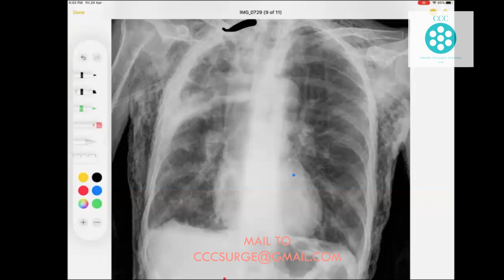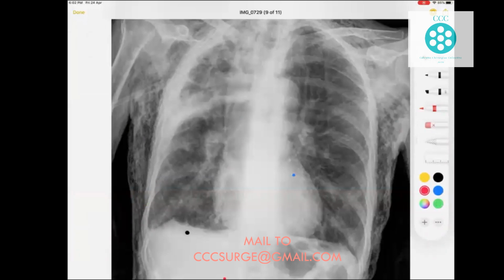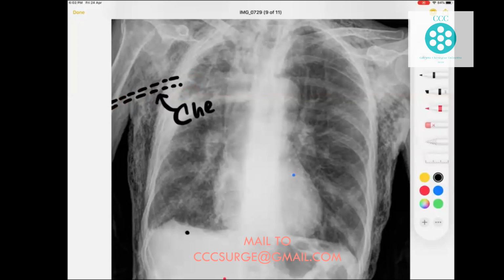Okay, let me see. I can see a fracture. Maybe there is a fracture of a rib, along with a surgical emphysema, and at the end of the day someone is pointing out, sir, have a look, what the hell is that one? If that is this pipe, then maybe it was given by someone to take something out from the air. I am not very sure, but this is a chest drain tube. This chest drain tube, as you can see, is taking out the air.